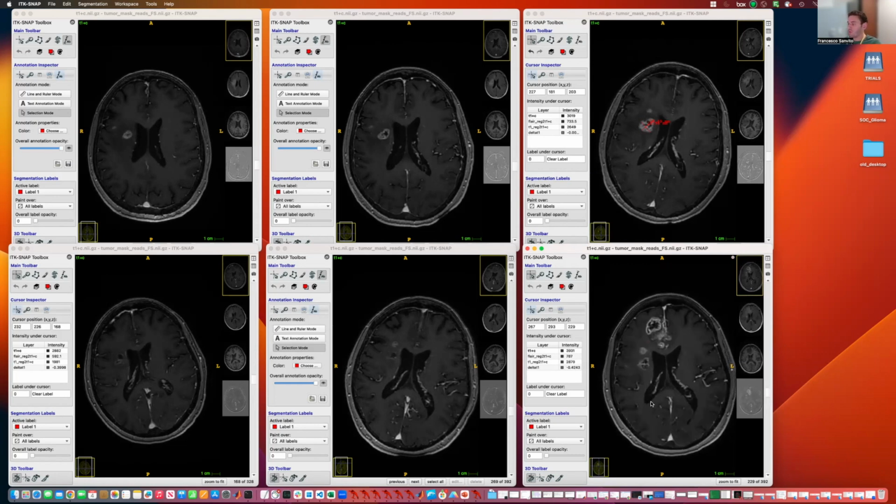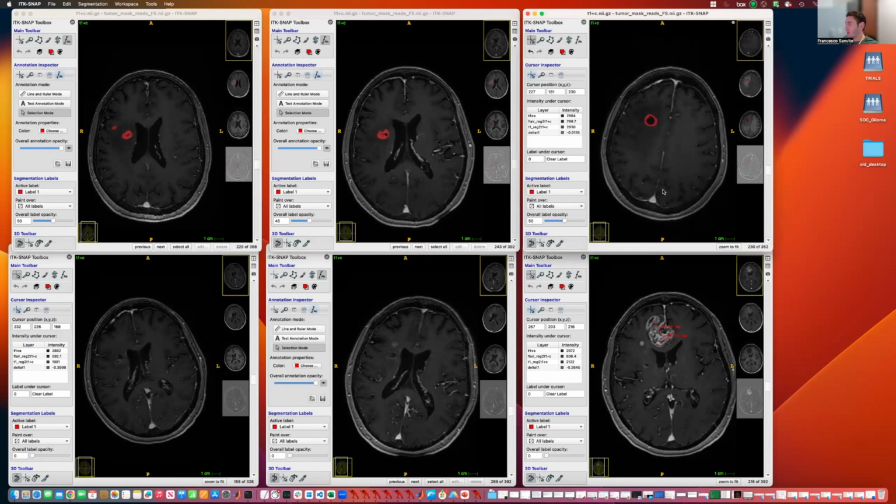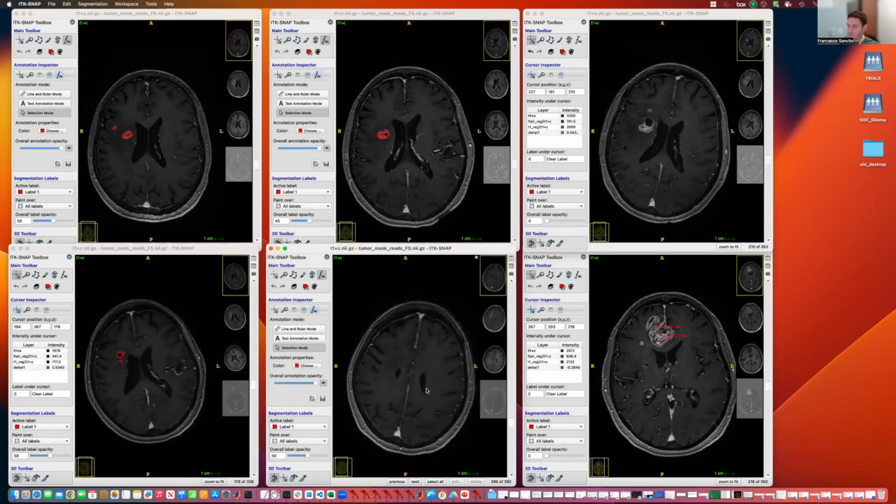So ultimately, we have two measurable lesions in this final scan. We can also, as I said, look at the segmentations and check that they correctly represent the tumor, which I already did. And I also made some adjustments. As you can see, part of the contrast enhancement that is segmented is part of the cavity border, and it represents some linear pericavitary contrast enhancement. And the same here, and the same here.